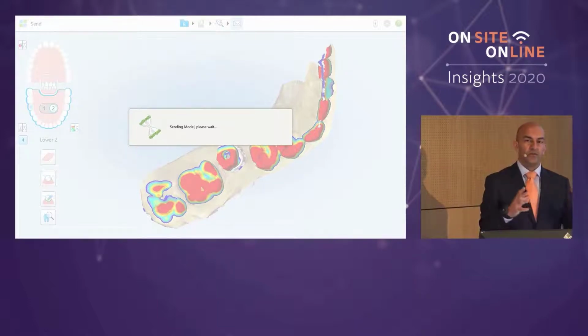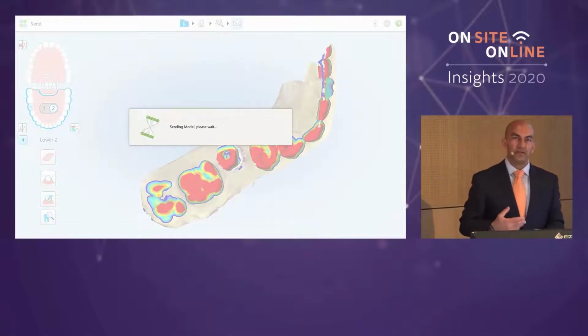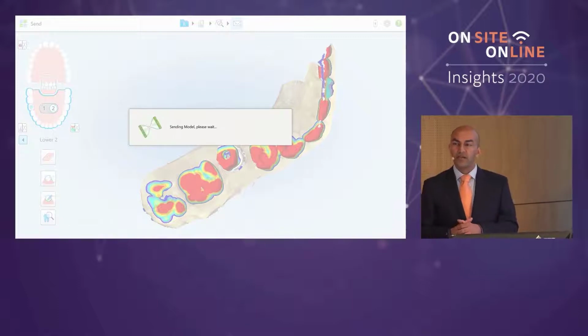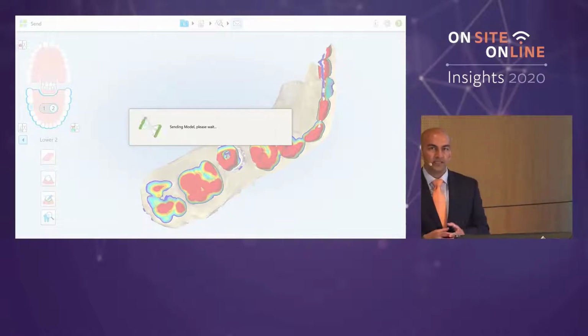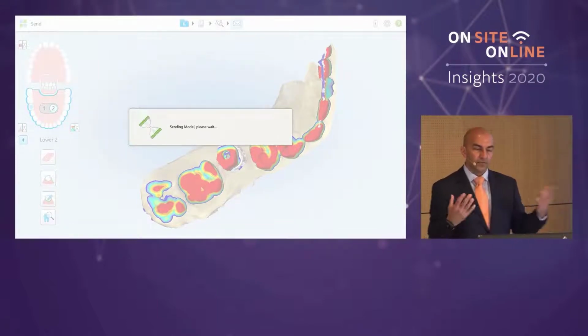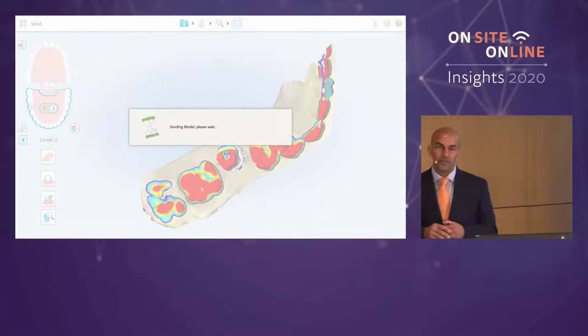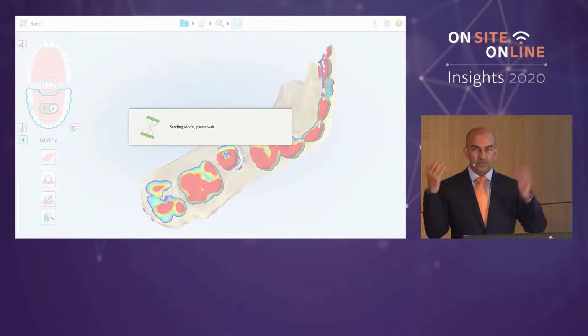Whether you're doing a simple crown restoration, and then later you go to your reseller and say, I can do crowns now, I want to do quadrants, and then you say, well, I want to do implant restorations, and maybe later anterior restorations, it helps you build through your progress. The reason we're going to bring in Exoplan later on is because you'll see some of the same tools and the same techniques applied across them. The developers have thought about this in producing the different platforms to ensure that their existing customer base doesn't have to relearn things.